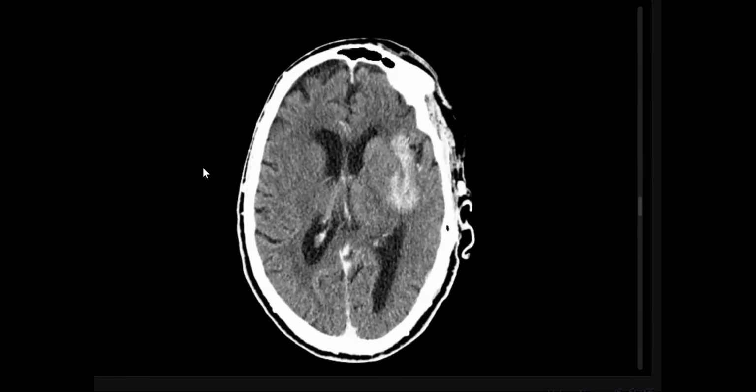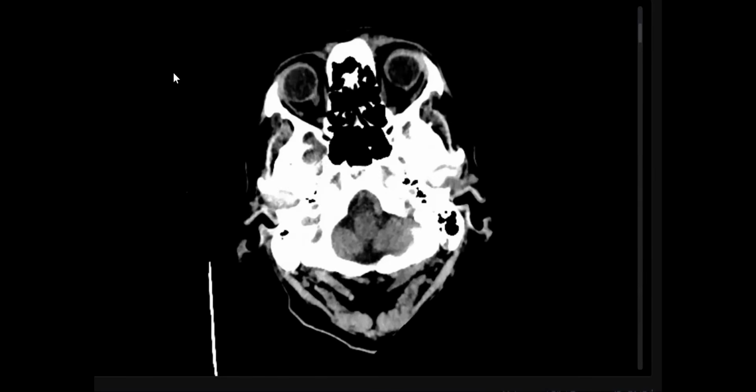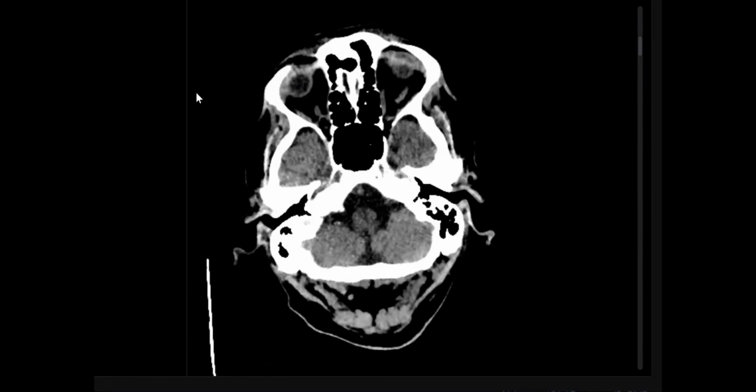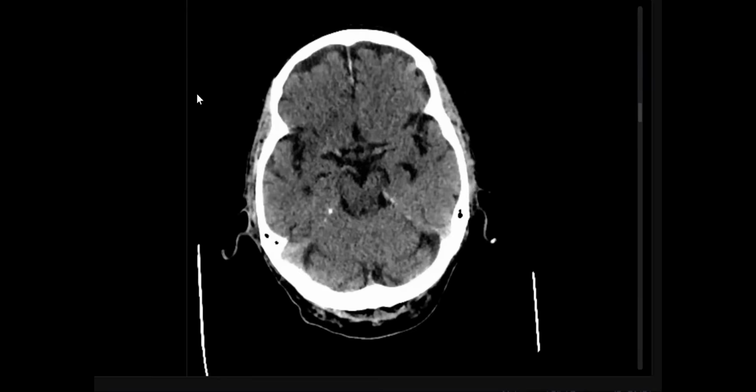I know it's a little bit difficult case. So I'll show you another case, then back to this one. Again, as this patient is suspected of left hemiplegia, remember, my friends, it's an important case. So you are looking at the right side. Yes, sir. Do you see anything?